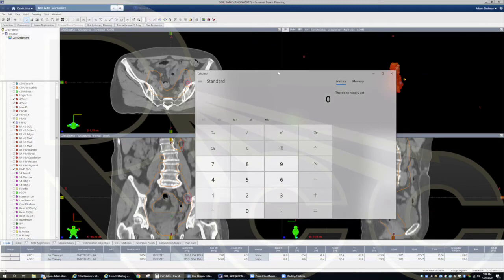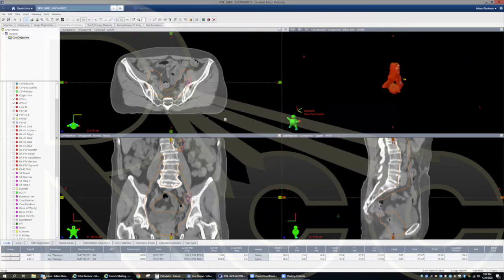well, we would just do PTV-45 divided by PTV-55, 81%. So it needs to fall off about 19% or 18% in this case. And so if you look at 5% per millimeter, it's about 3 millimeters. So I've done just that. So if we look at this RA45 max, here it is. It's 3 millimeters away. So now I know all my hotspots will be confined here. Anything that's even higher than what I envisioned for these hotspots should be confined within this 3 millimeter margin.